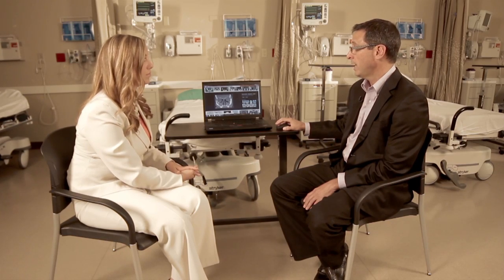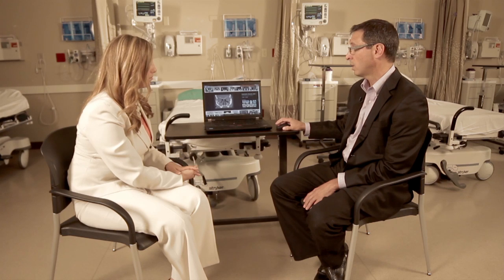So I always look at all of my CAT scans with my patients, and we will look at the structure and the anatomy of the nose and can help them to see where their sinuses may be having trouble and then how I might be able to help them. And if they have symptoms like we've talked about, congestion and headache and feeling tired and just not feeling very good overall, they can do a sinus assessment survey at helenaent.com, and then it's really important that they come in, get evaluated, let me listen to their story, look in their nose, and then if we have CAT scans to review, we can talk about why their sinuses have been giving them so much trouble.